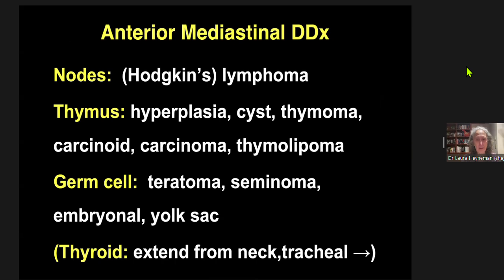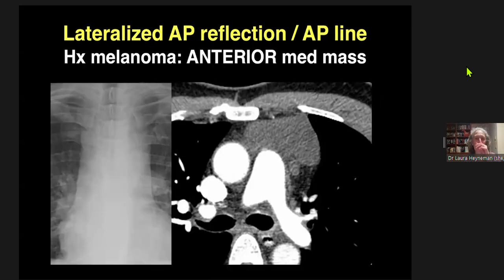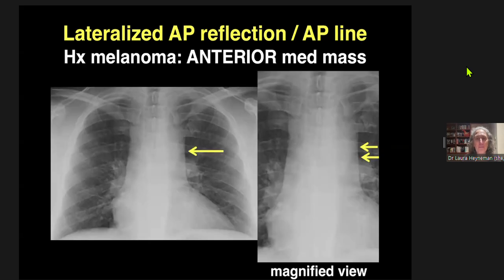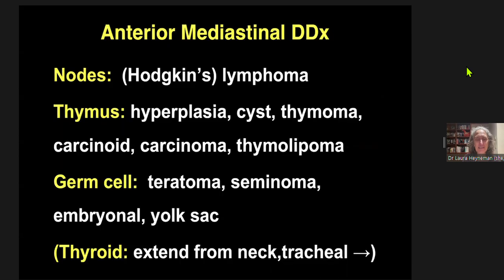So again, there are a host of things that could be in the anterior mediastinum. In somebody with melanoma, I worry primarily about metastasis.